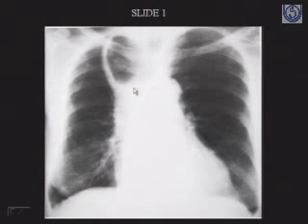Now, pertaining to this case. In this case, the cause could be mainly the cardiac enlargement, or could be a vascular cause like the ascending aorta or the descending aorta, or the esophageal origin for the mediastinal widening. Okay. Whenever you see a cardiac pathology, you say cardiac.